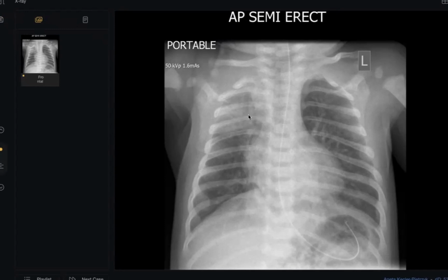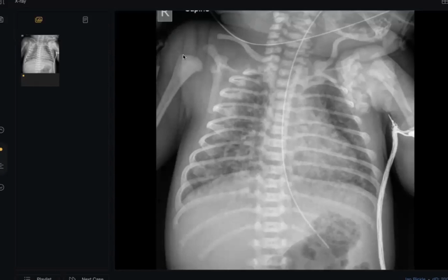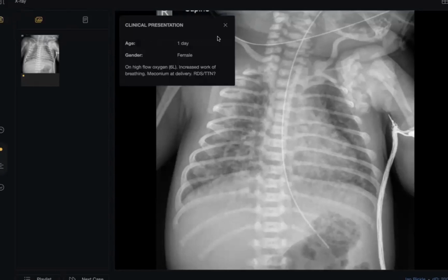Anyway, number one, it is pneumonic consolidation because it contains air bronchogram. Then trust yourself. Some examiners try to make you hesitate. Don't worry. It is a lobar pneumonia. By the way, in neonates many infections present without fever, especially in the chest, I think related to the immaturity of immunity. Then antibiotic treatment. Okay, next candidate. Thank you, sir.